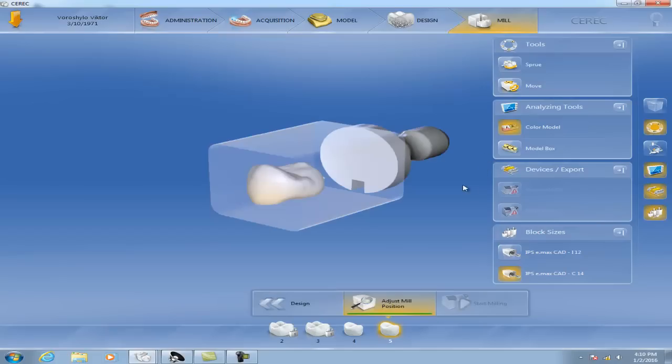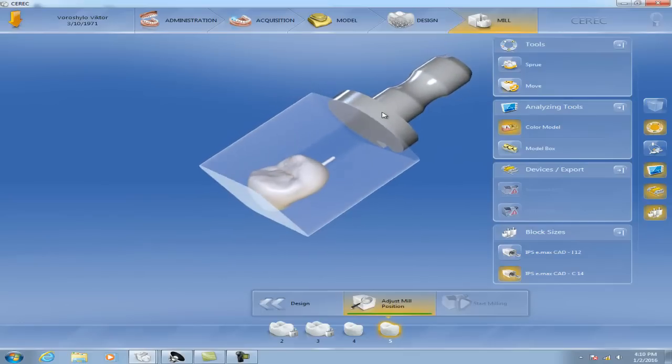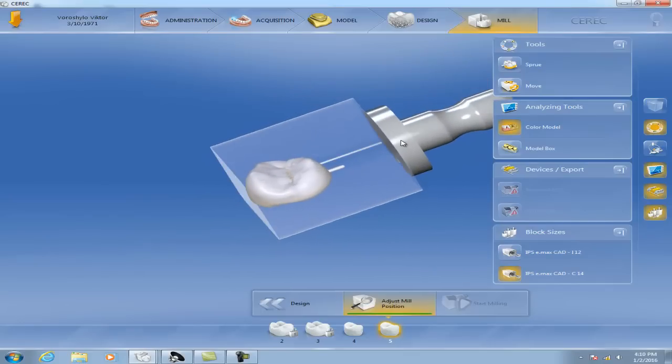again, there's all the information you have. Again, you see that it's custom made by me. Everybody has a different layout. Okay, you can choose your own, but that's what I chose to work with. So I'll try to keep the screen empty on the left side and all my tools on the right side.